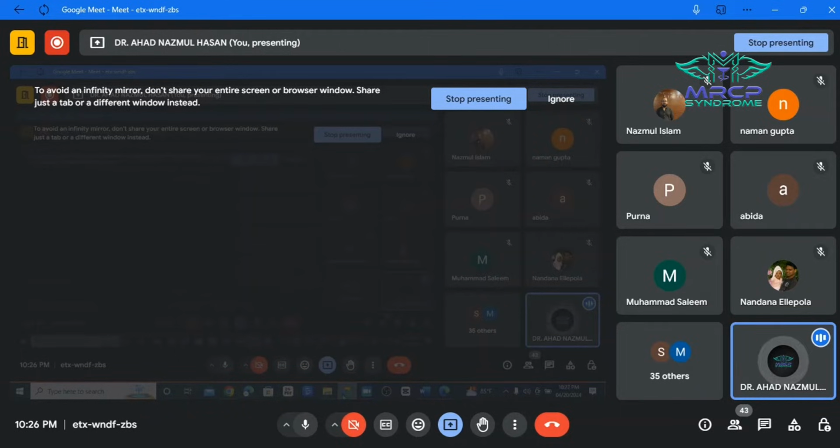So in case of T1 weighted image, both TR and TE should be short. In case of T2, the TR and TE, both of them would be long. And in case of FLAIR image, the TR and TE should be much longer compared to the T2. So it should be shortest in case of T1, and the unit is usually the millisecond.